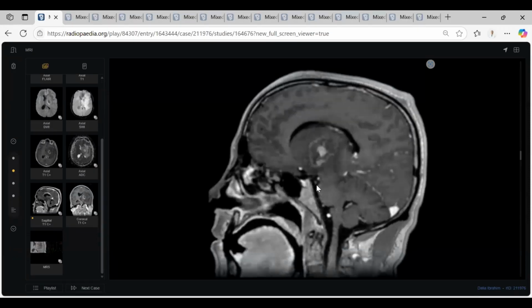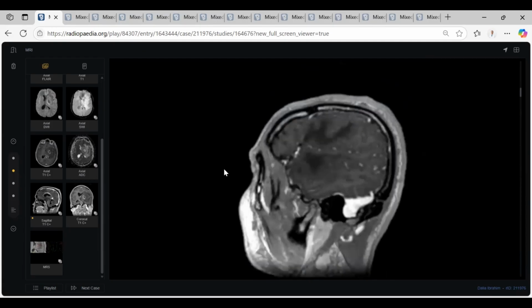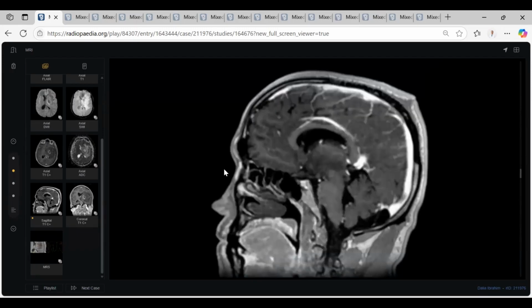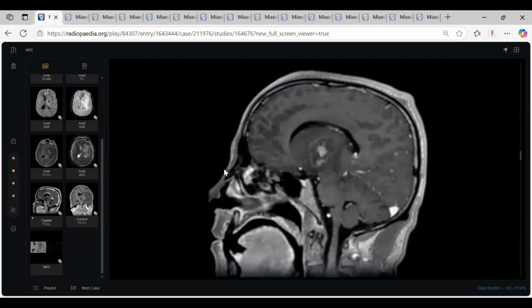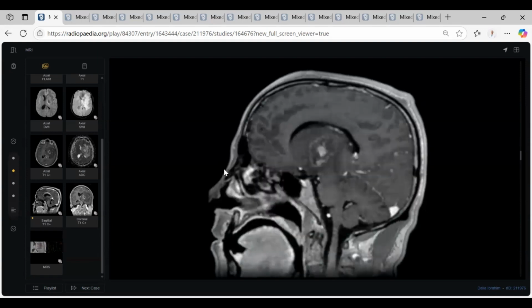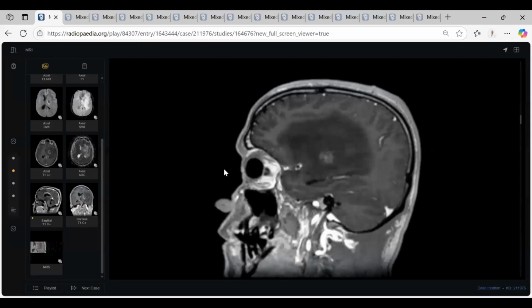So three critical signs should be excluded in any tumoral brain case. Ask the examiner for sagittal, either T2 or post-contrast, and tell him you will exclude tonsillar herniation, skull base infiltration, and check the basal cistern. Like this, the examiner will trust you so much.